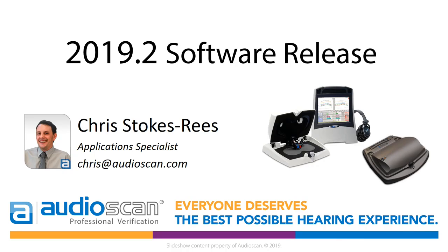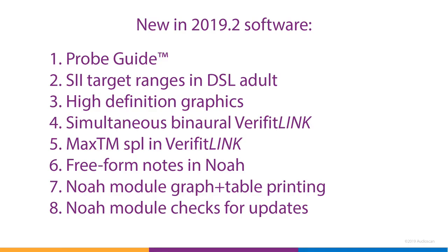This video will give you a quick overview of the 2019.2 software release for Audioscan Verifit 2 and Axiom verification systems. We'll look at each new feature briefly. Please consult our user guide or the context-sensitive help available in your Audioscan product for complete instructions for use.